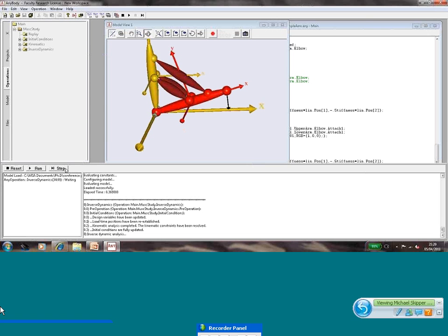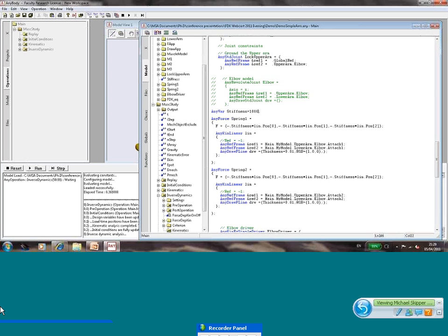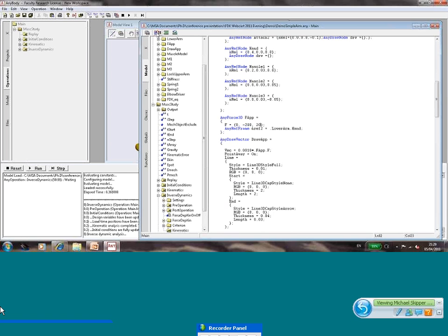I will just run it here a couple of times, just to show you that it's actually resolving all 5 degrees of freedom with these two forces. I will set the stiffness down again to 1,000, but then I will try changing the external load. If I add 20 Newton in the Z direction, which is out of the plane from the front, then we should get something completely different. So I will put in 20 here, and then I will reload.